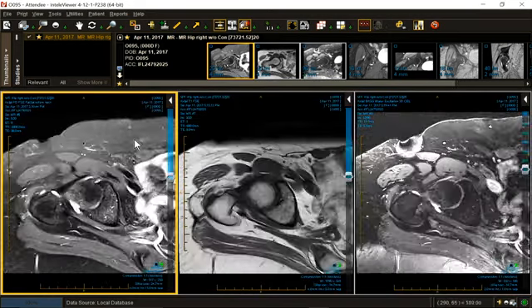Why isn't it a sulcus? Doesn't have a round top. It's too deep. It's through and through. It's serrated.